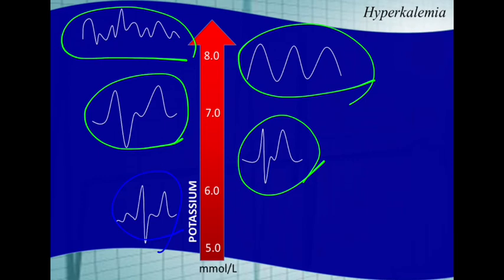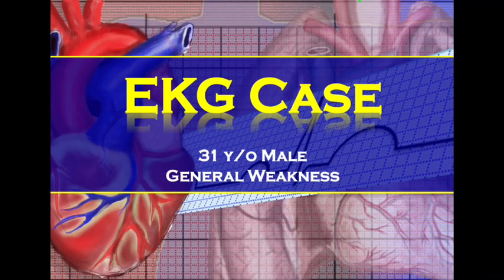So these patients require emergent treatment. It's difficult to identify without getting, of course, a solid history. Remember, every 12-lead EKG comes with a patient, and this EKG fits that patient's history and the condition that they were in. And that, of course, is this EKG case.